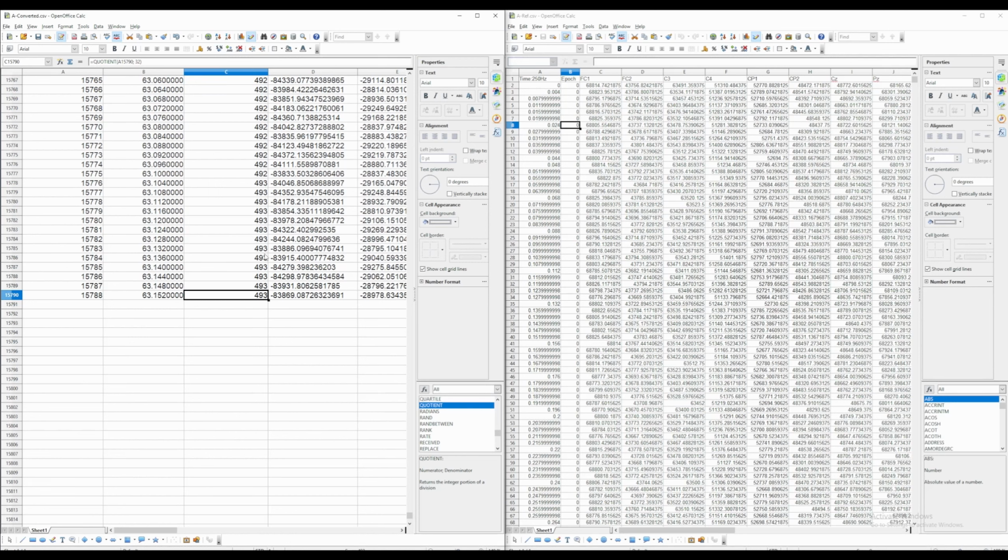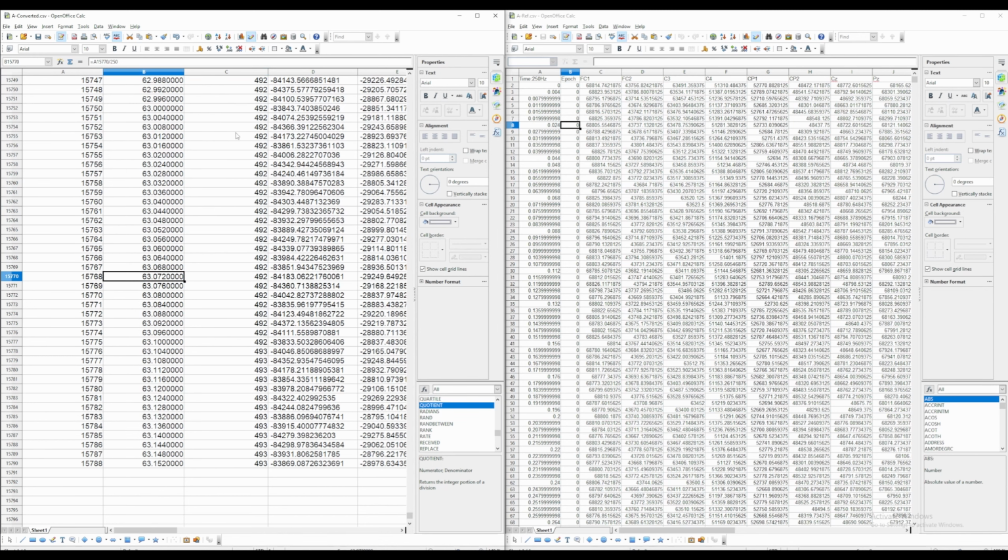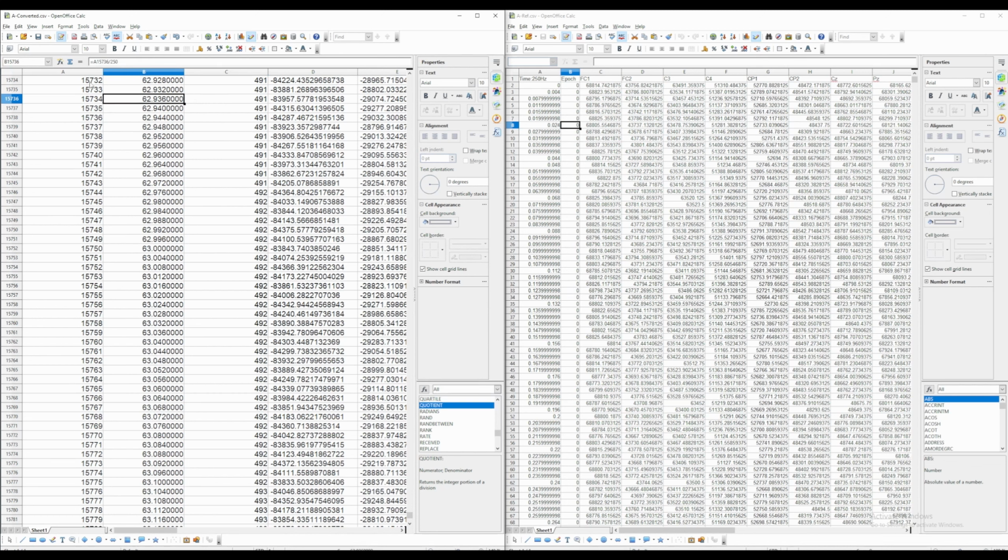So here actually you see that my chunk isn't complete. I'm just going to leave it here to show you how OpenVibe really doesn't like it, and it will throw you an error if not crash out completely. But our file is basically done. So we have to save it as CSV. That way it's going to save it as a text file and remove this formula when it's saved as a text file.